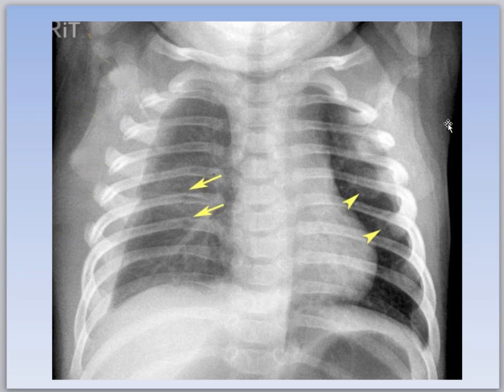Okay, what's going on here? This is a child and came into the ER. We won't talk about the atelectasis. I want you to just look at ribs. Okay, let's look really carefully. Let's follow this rib first. When we look for fractures, we look for breaks in the cortex, in the outside. That one's okay, but look at this one. It's a nice example. Maybe on my Camtasia I can blow this up for you. But there's a fracture, fresh fractures right through here. So this is actually, it was a child abuse case, unfortunately.